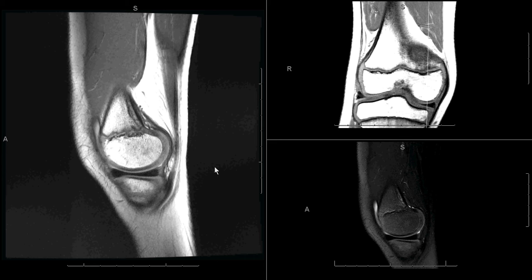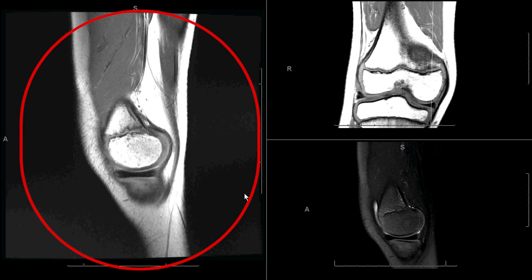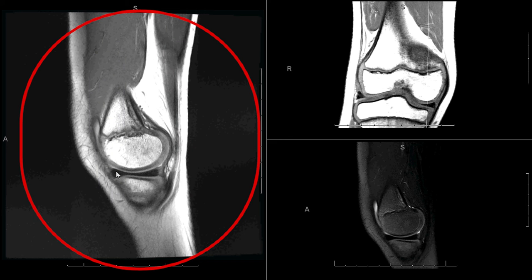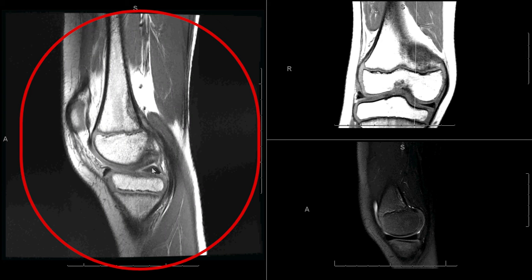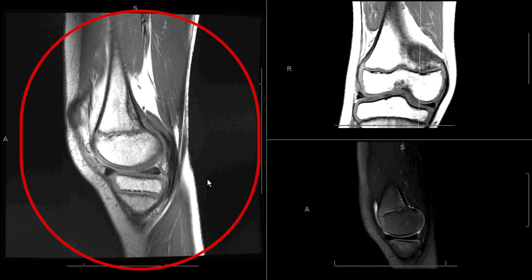So let's first look at the menisci. As in the adult patient, you expect the medial meniscus or lateral meniscus to have a uniformly dark signal intensity. And one of the differences in pediatrics is that you may have a higher signal intensity, especially along the posterior horn, that does not extend to the articular surface. And it's felt to be related to increased vascularity and not a tear. So it's important to identify this as not myxoid degeneration, as you might expect in an adult, or a tear. Normal finding in a patient, especially one whose physes have not yet fused.